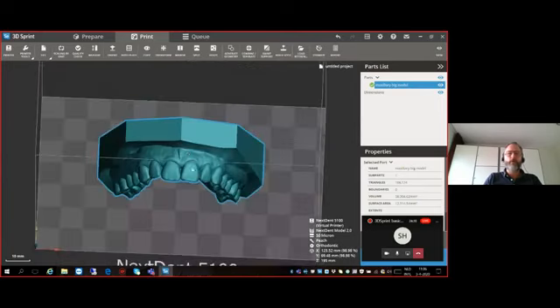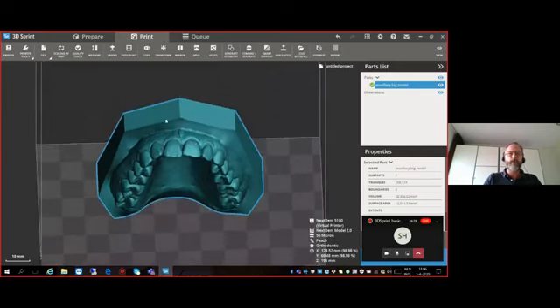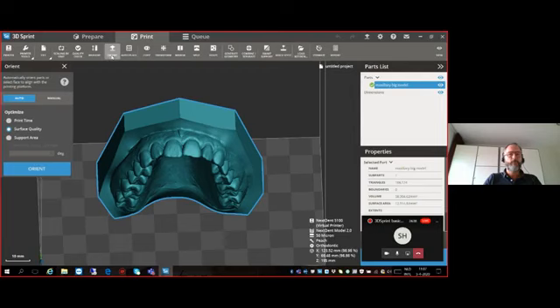And there are several things also that we want to change here, but I'm going to start first with the orientation of the part. We have several options, like I showed you before, the auto place. Another function is the orient option, and we will have the transform option. First, I would like to show you the orient.